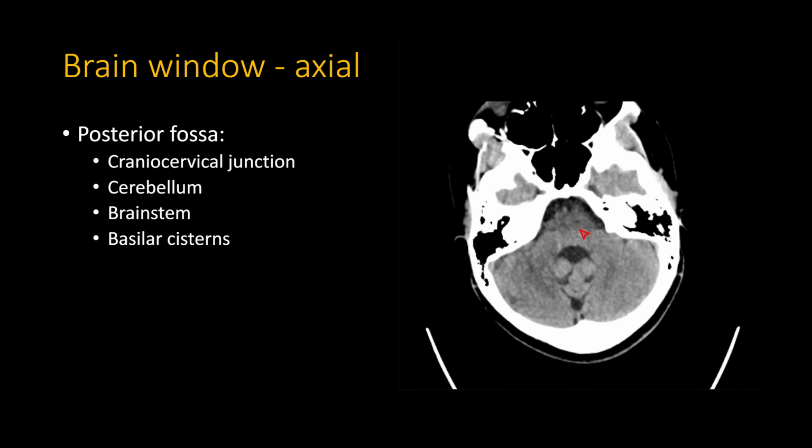For instance, here you can see the anterior aspect of the pons compared to the posterior is more dark, but that's just because of streak artifact. You can see this nice line here, and all this dense bone here. You can see what thickness of bone right here has caused that streak artifact, has caused this area to be artifactually lower in attenuation. So keep an eye out for those. Sometimes when you see hypodensities in the brainstem or cerebellum, always look at them in multiple planes, and that would allow you sometimes to see these lines that are very characteristic of streak artifact.